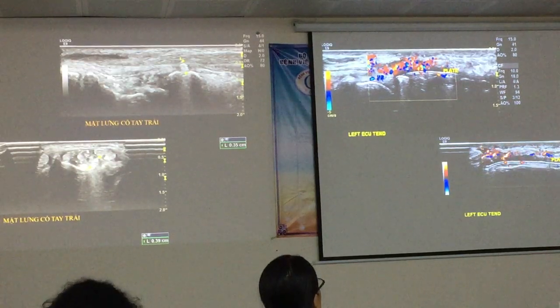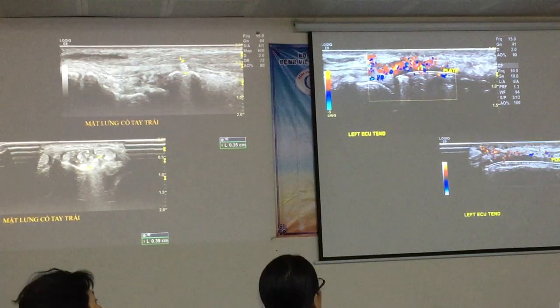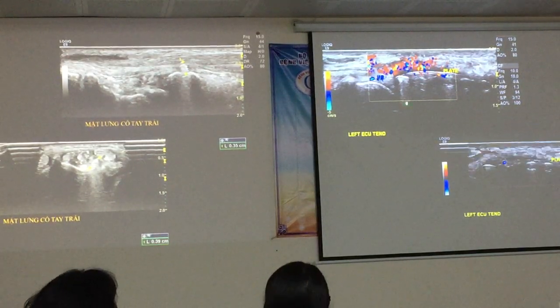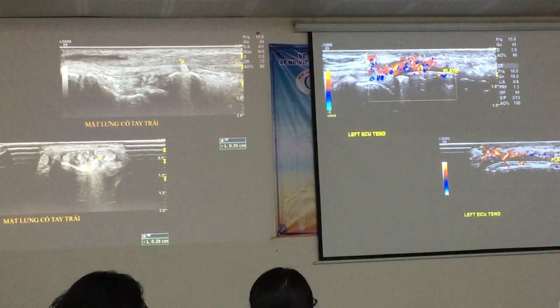This was another patient who presented with a plate overlying the distal ulna. And you can see here that this is the surgical plate just here.